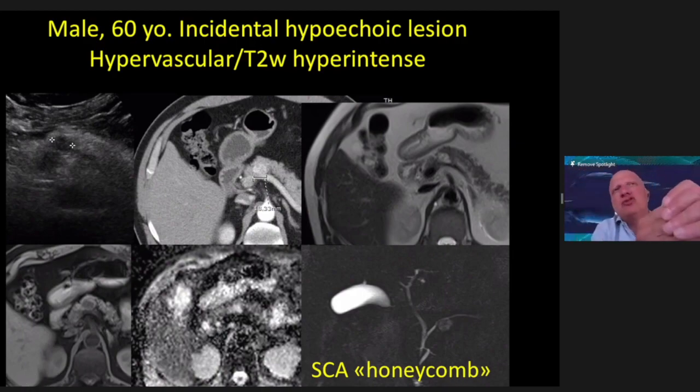are so small, so packed, that the stroma surrounding the cysts can be very well vascularized, thus with imaging techniques such as ultrasound or CT, not very sensitive to liquid, they can simulate a small solid lesion, and hypervascular lesion. But with MRI, we can easily make a correct diagnosis of this lesion.